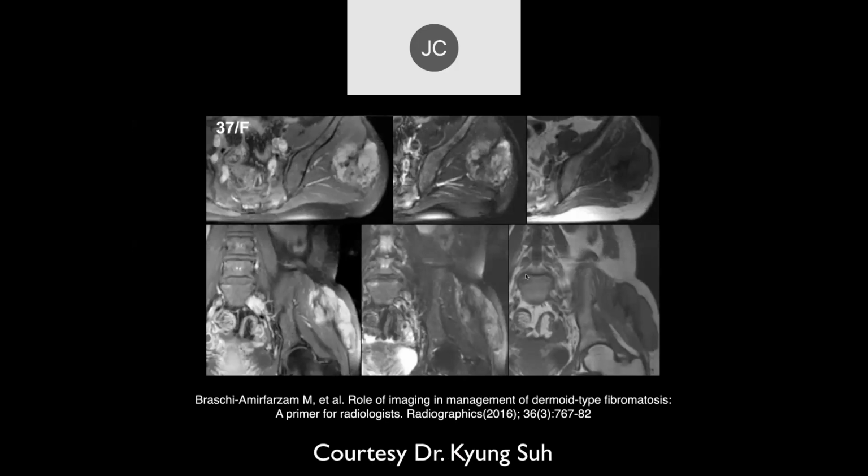37-year-old female. So looks like within the gluteal musculature, there's this round lesion there, increased signal on fluid sensitive sequences, and I guess isointense to muscle on that T1.